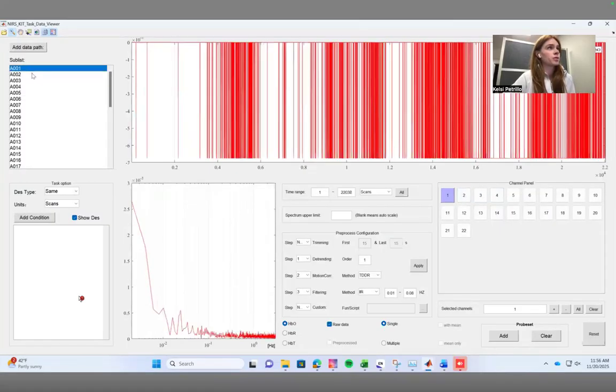Let's go back to our first subject who had some poor signals. So there are a couple things in fNIRS recordings that can cause poor data quality. The biggest things are just poor contact with the scalp. So hair can get in the way of that. The position of the cap and the optode on the head can also affect that. And then, of course, we know also that things such as skin tone, head morphology, all of these things can also affect the way that the optodes are interacting with the scalp.